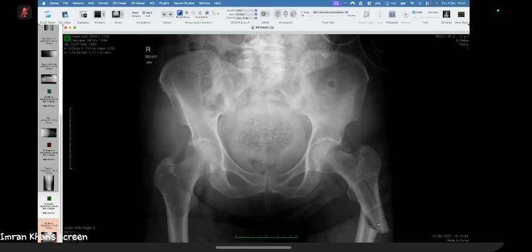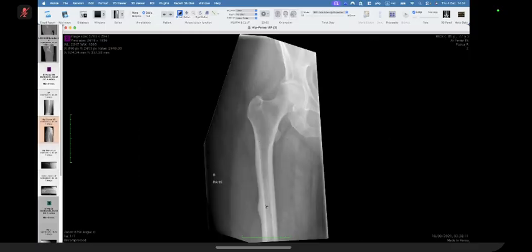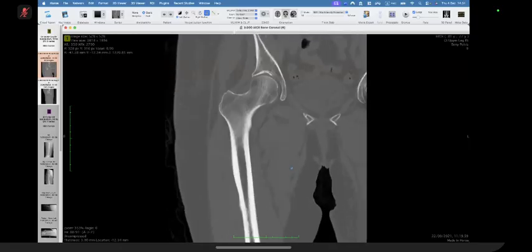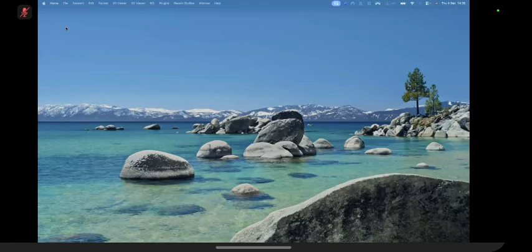And the clue, even if you were not sure about that, was in this radiograph. There is periosteal thickening, and there's periosteal thickening at almost the same level on the contralateral side, because this patient has got an insufficiency fracture, which I can show you here. If you had done that, then I would have shown you the CT scan, which would have shown you the fracture. So this is a bisphosphonate insufficiency fracture. Unfortunately, this becomes a clear fail. You get a zero on this case, because you couldn't answer the question right.